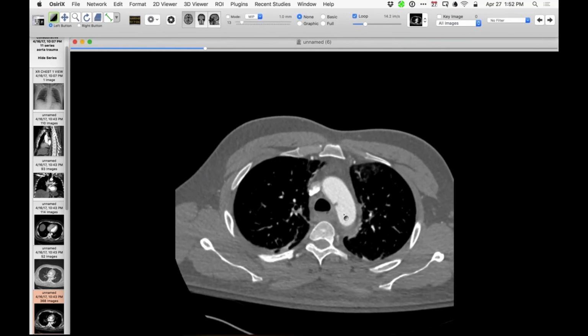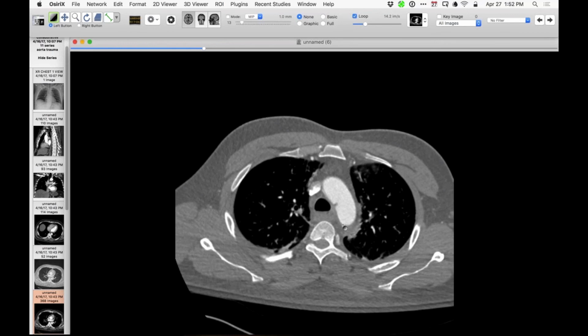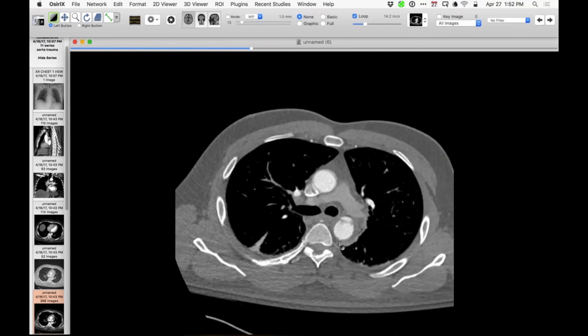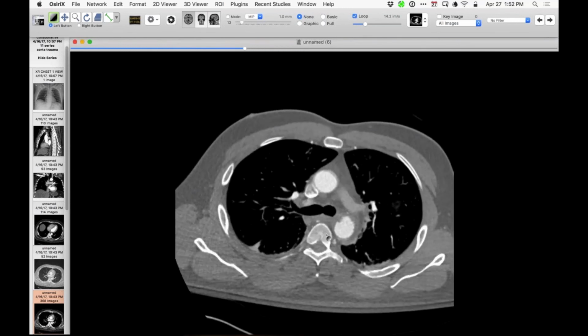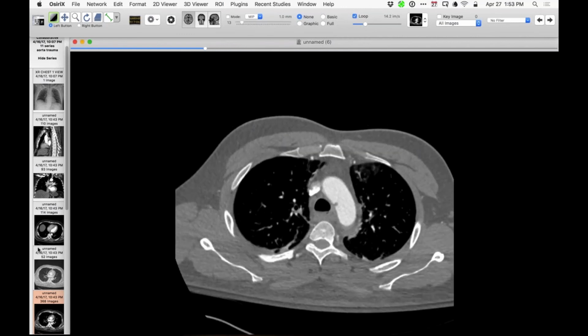So in terms of, there's a classification system that interventional people use, at least in relation to the use of endovascular stents. So this would be a type 1, where there's really just an intimal injury, maybe a little thrombus, whatever that is. And then type 2 is intramural hematoma, which I've not seen. Type 3 is this one, which is pretty classic. And then if I remember correctly, type 4 is active extravasation from the aorta. So just an example of simultaneous type 3 and type 1.